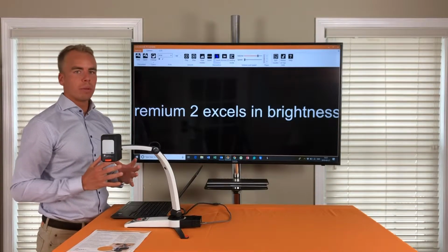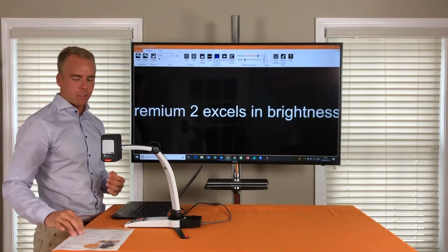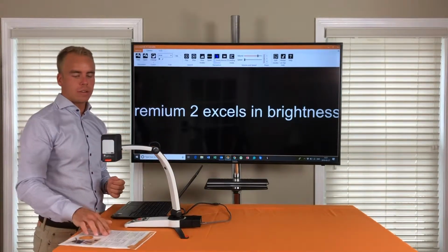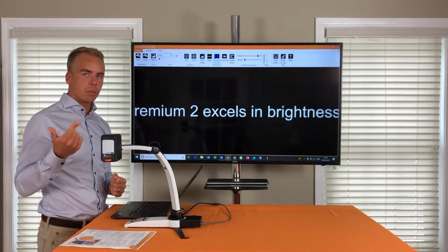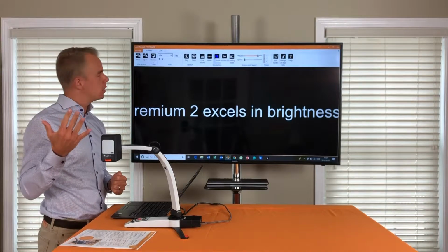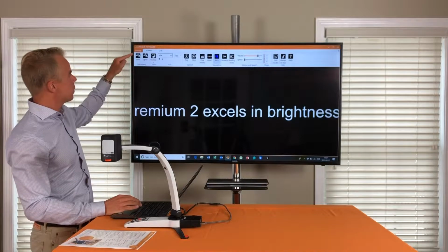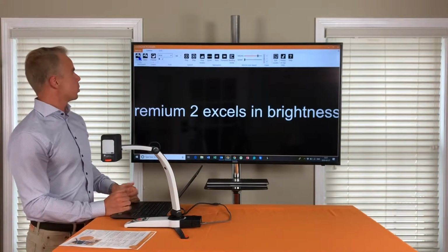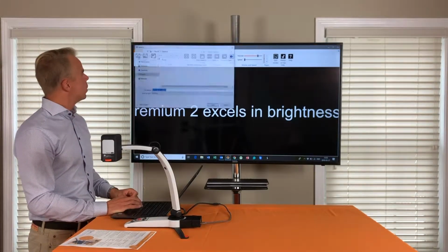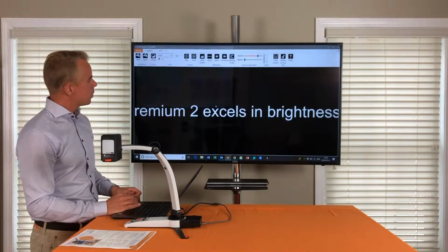Another thing that I can do with this one is save and open documents, meaning that I can save this text that I have here on my paper into either a Word document, PDF document, zip document, TXT document, or WAV file. I go up here, it says document, save, or the short command will be Alt plus F5 at the same time on my keyboard. I save it on my desktop as Word file, save.